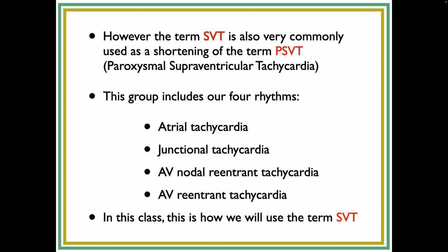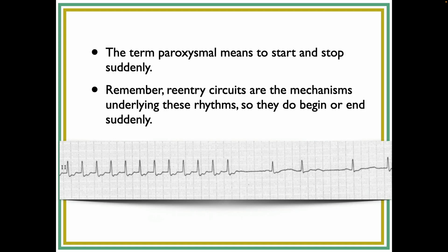So again, the term paroxysmal means to start and stop suddenly. So remember, this slide came from when we were talking about re-entry tachycardia. So here is SVT. It's regular, it's fast, it's no discernible P waves, narrow complex, and boom, it just stops and goes right back into a sinus rhythm. Okay?